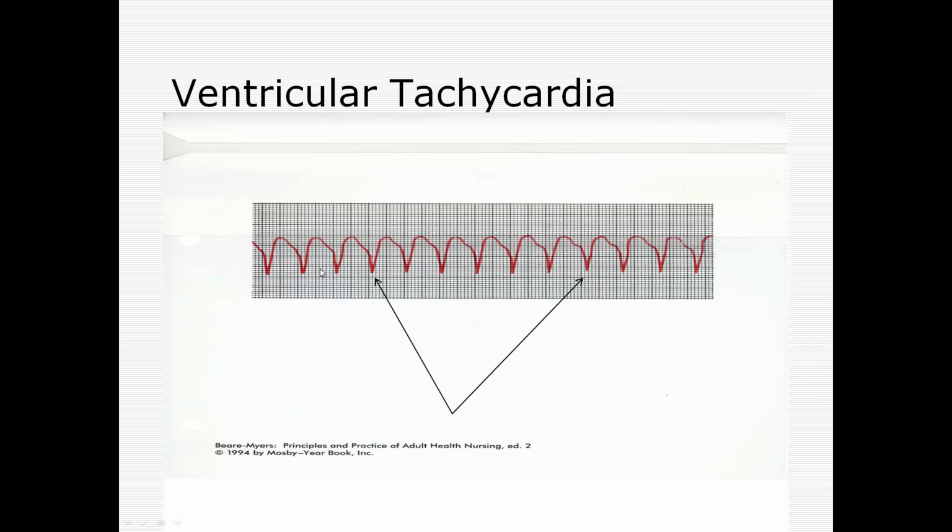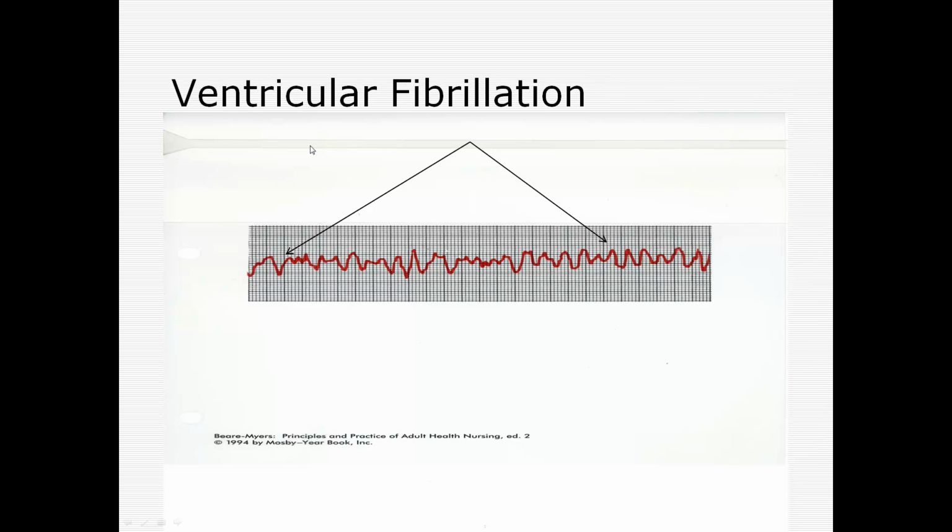If you add this up, 1, 2, 3, 4, 5, 6, 7, 8, 9, 10, 11, 12, 13, 130 if those were normal heartbeats. Patients usually faint. If this is slower, some patients are awake on slow ventricular tachycardia. This is also a lethal rhythm. You need to do something about that. These are the rhythms, this one and VTAC, when you see on the movies, we need to shock the patient. That's what they're shocking them for, is to get them out of VTAC and VFib.